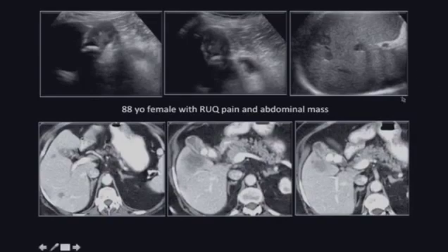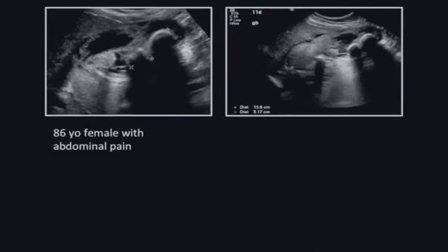Here's the correlative CT imaging that shows gallbladder mass, gallstones, direct liver invasion, and multiple liver metastasis of this advanced stage gallbladder cancer. How about this case?